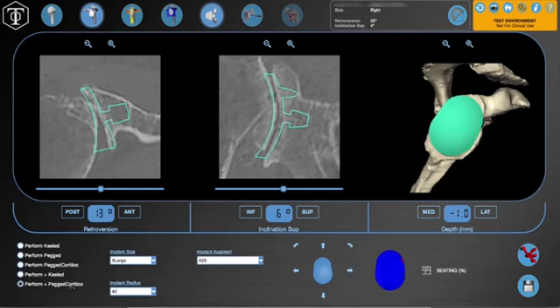So as we shift to a Perform Plus component, you'll notice that there's an increased augmentation posteriorly as opposed to some of the other components and implants that are out there on the market. This is an angled posterior component as opposed to a stepped component or a fully angled glenoid component. You'll see that this has the native backside radius of curvature of a normal glenoid, and then it angles posteriorly. So this component actually comes in degrees of 15, 25, and 35 degrees of posterior retroversion for the posterior augment.